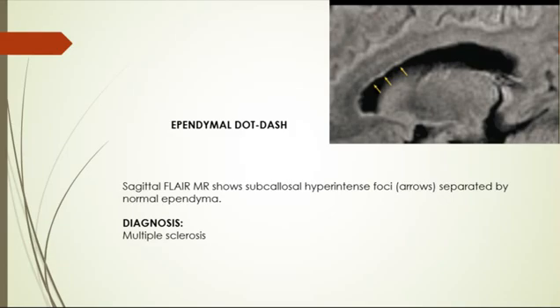Okay, so we should be careful for that. FLAIR is very sensitive in young patients for the earliest disease, and keep in mind this is sagittal FLAIR, which we rarely do here in our protocol. We should maybe change the protocol, especially in patients with suspected MS.